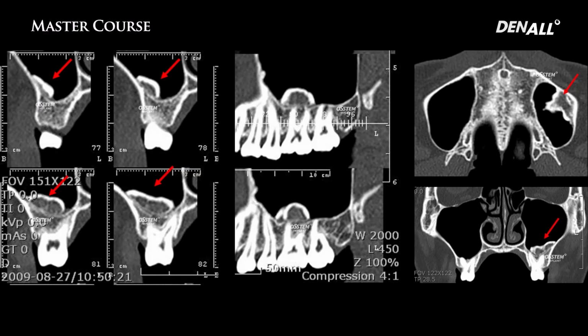I took a CT. The mucosal thickening or the sinus itself looks healthy. The air is filled here. There's radiopacity in the sinus floor side, and there's some sort of irregular dome-shaped mass. In axial view, it looks quite irregular.